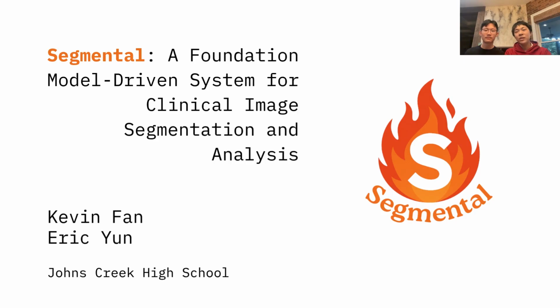Today, we're excited to present Segmental, a foundation model driven system we've built to accelerate clinical image segmentation and analysis, making advanced medical AI accessible to everyone.